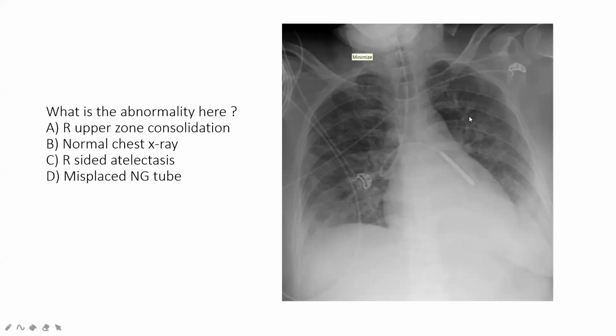There's a poll out now that people can answer. Okay, so yeah, we can see that people have mostly got it correct. It's great. So this is a misplaced NG tube.